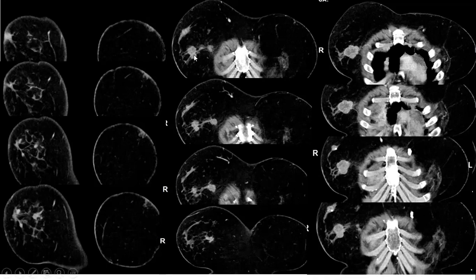Look, this is the tumor band extending between all, even the upper outer lesion. Look for the tumor band extending from that and from this. There are interconnections between all of the lesions, as if even multifocal, as if it is the same ductal system, even for the lesions far away in the upper superior breast.